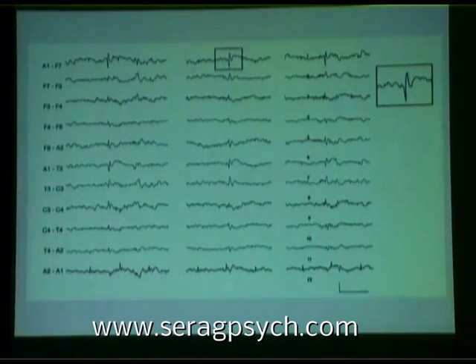Small, sharp spikes, you just have to get to know them by their morphology. They look like that. They're much quicker than the abnormal anterior temporal spikes. That's one aspect. And the second thing is these are normal phenomena, but they're very widespread. You see how many channels will express them at some point. See that? It's a little over 50% of the channels because they have such a huge field. And these are seen almost exclusively in sleep, and you'll get used to them eventually.